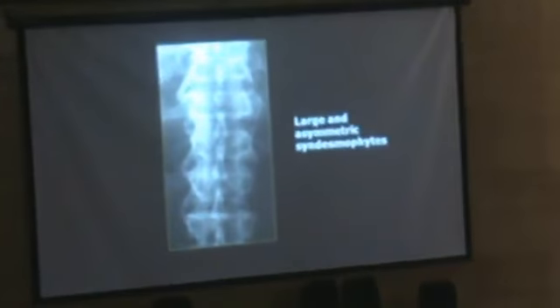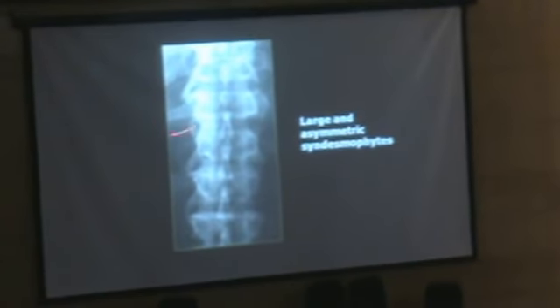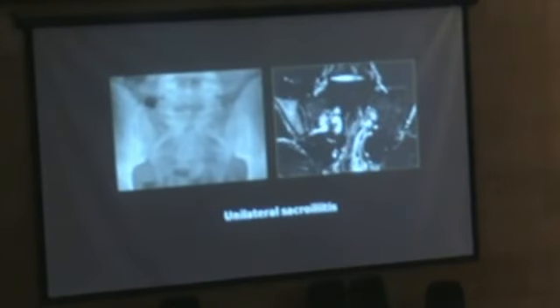We see an example of a large and asymmetric syndesmophyte here in a case of reactive arthritis. And this is another case that I want to show you of unilateral sacroiliitis in a subject with reactive arthritis.